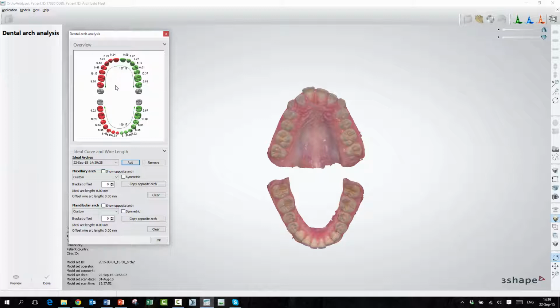Yeah, and we obviously have a separate video on teeth segmentation, so please check that out. This number here is all the teeth added together. Okay. And this is the arch wire added together with these teeth. Yes. Good.